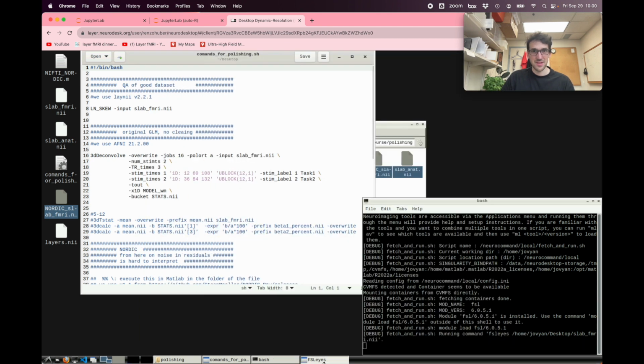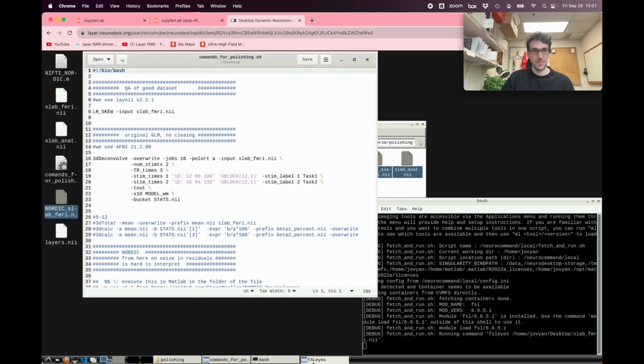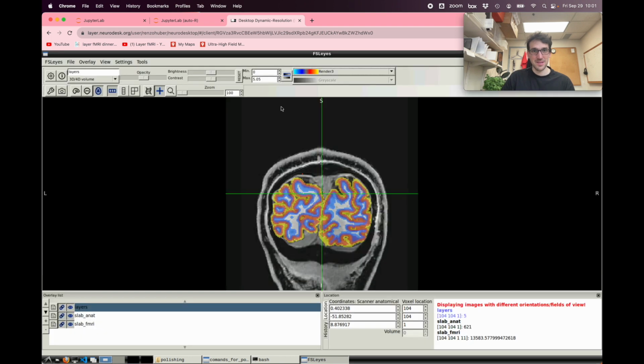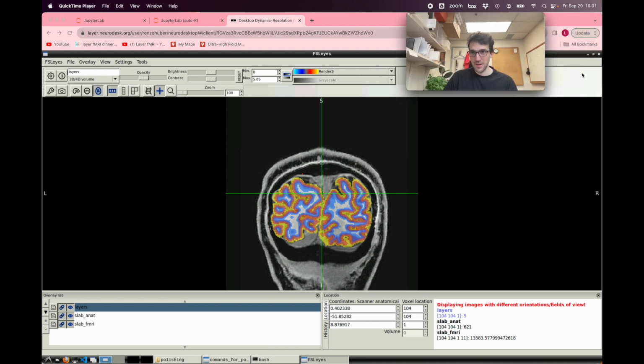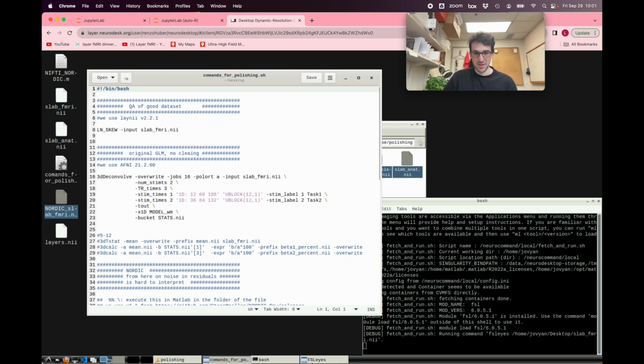And I lost my FSL now. Where did I put it? Maximize. I have it back. It's somewhere outside my screen now.